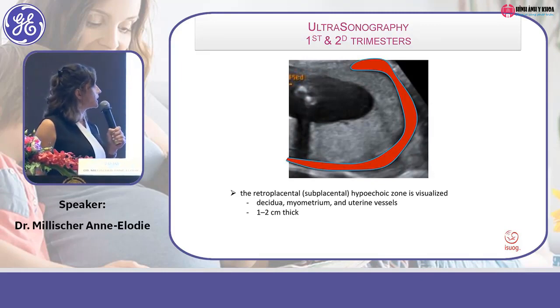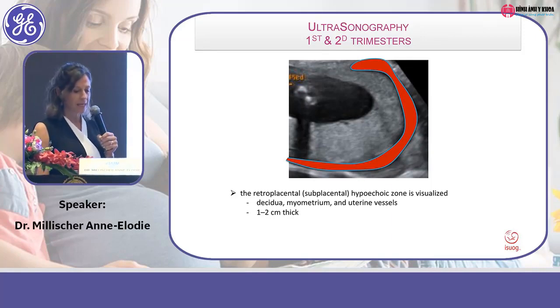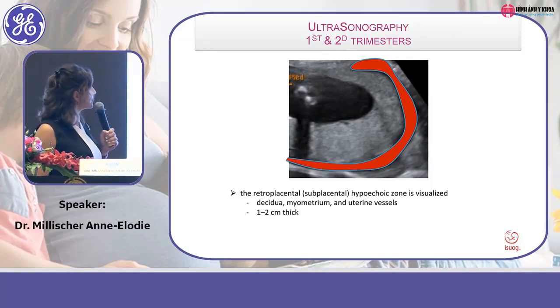The ultrasound that you use daily, and you know this typical aspect of the placenta, this hyperechoic aspect.